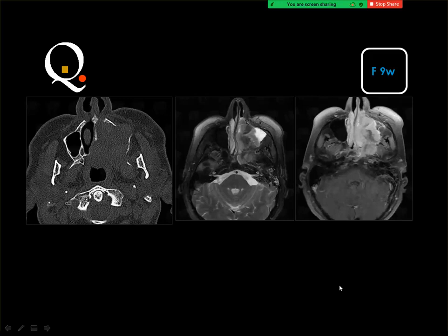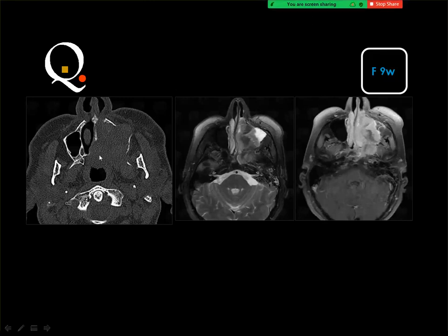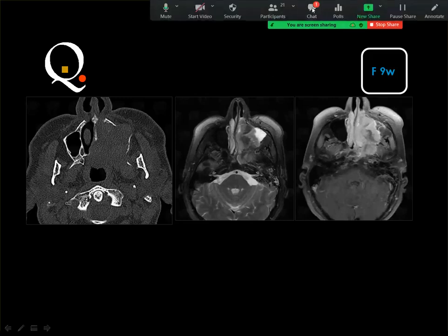Both can fit. And this patient's age is actually not right, but you got an adult case with a mass also in the region of the maxillary sinus that has extended into the nose as well as in the pterygoid fossa. Then what do you think?